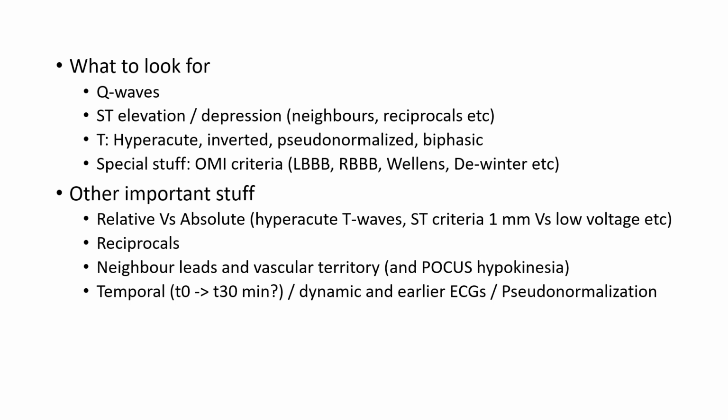Sorry. Then we look at the reciprocals. Even if it's not 1 millimeter, the reciprocals may indicate that there's definitely something going on. If there's an inversely depressed area where the main lead has ST elevation and the reciprocal has ST depression, that's a problematic one. Then we look at the neighboring leads, right?